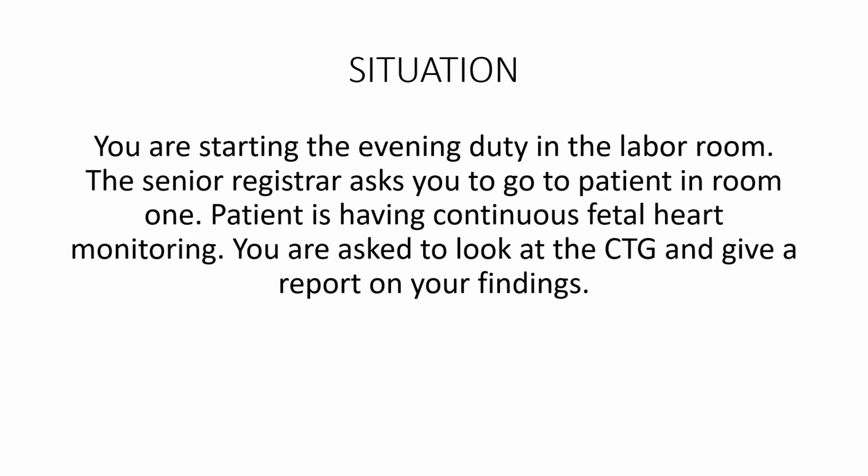Imagine a situation. You are starting the evening duty in the labor room and the senior registrar asks you to go to the patient in room number 1. This patient is having continuous fetal heart rate monitoring. You are asked to look at the CTG recording and give a report on your findings.